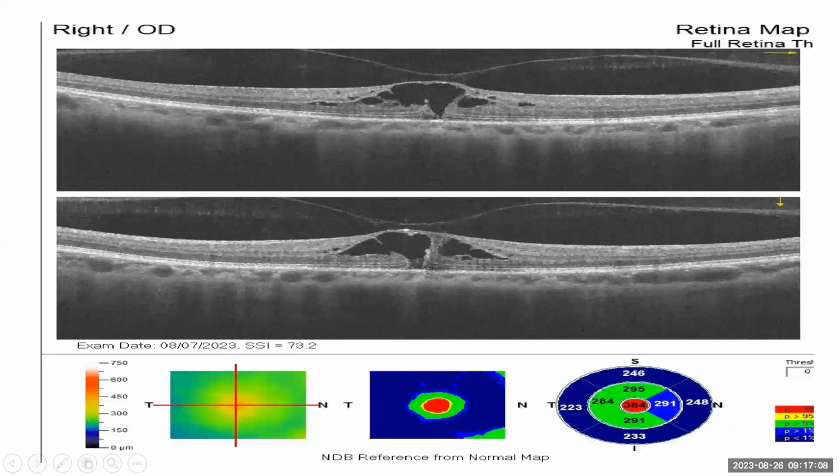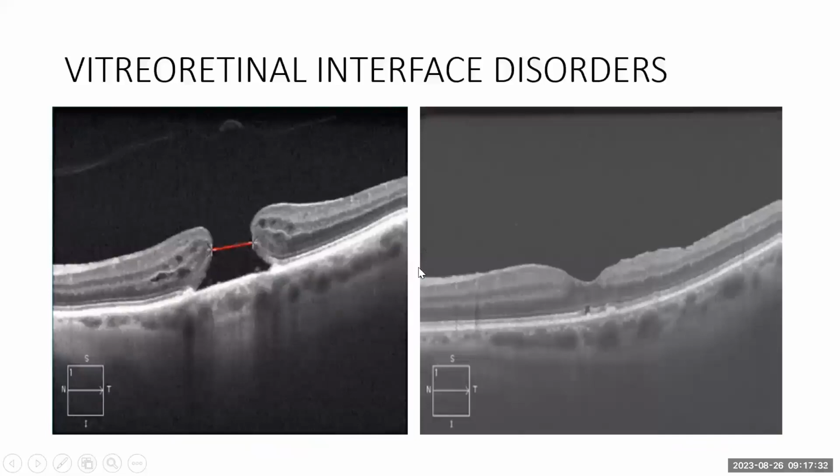So this, the right eye, I just brought it out for emphasis. The layers are distorted, the RPE is continuous. So you have a full break. This outer layer around the ILM is still standing, but you already have a full break here, okay? Anyone can actually pick this up. This is a macular hole.